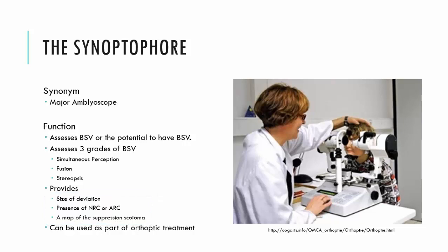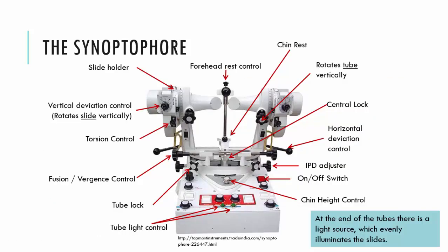Another use of the Synoptophore is that it can be used as part of orthoptic treatment. It's not commonly used as part of orthoptic treatment in Australia because it does require that your patient come into clinic for treatment, and we usually prescribe treatment that can be undertaken at home rather than coming into the clinic. Okay, let's take a look at this instrument.